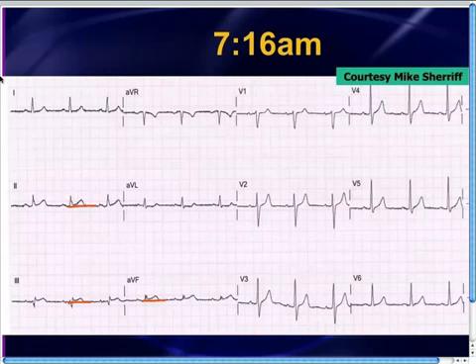Most EKG machines are programmed so that they will only pick up ischemia or infarction when the ST elevation or depression is at least 1 full millimeter. So you can be having an acute coronary syndrome with ST elevation or depression of a 0.5 millimeter or 0.9 millimeters, and your EKG machine at most is going to call it non-specific, or in this case, it'll just plain call it normal. But Mike knew enough to not follow the EKG machine interpretation. He was concerned about lead AVL as a possible early marker of inferior wall ischemia.